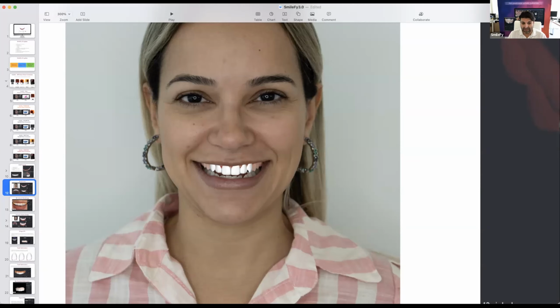Now, 2D smile design and 3D smile design are fine, but one of the biggest challenges I had over time was this: in our app, we use natural templates, scanned from patients with beautiful teeth. We create these smile donators. The smile donator concept was started by Paolo Cano, Christian Coachman, and Jan Haito, of course, the pioneer of smile donators.